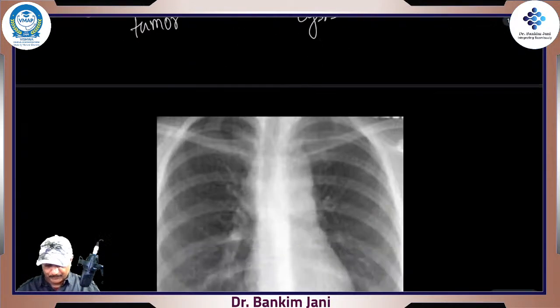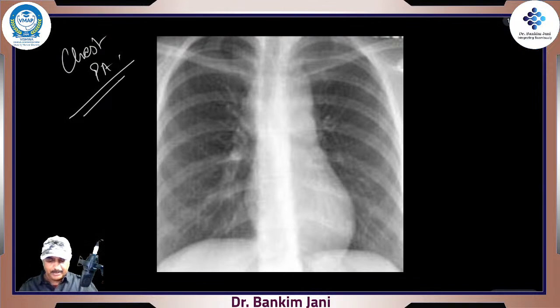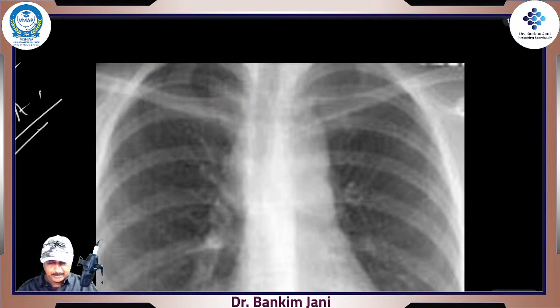Now let's see some of the cases, so it will make things very crystal clear. Immediately you'll say that this is an X-ray chest, PA view. And what we are watching, can you really see? Let me zoom, and here is the trachea. Let's take another color, black. This is the trachea. Watch the trachea.